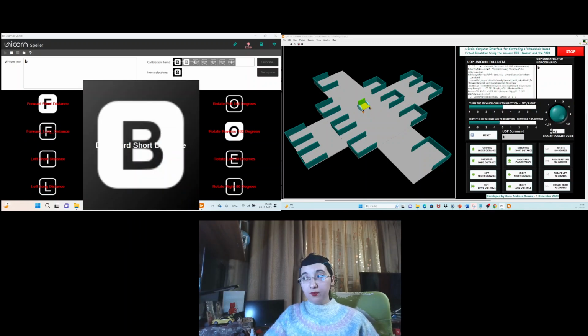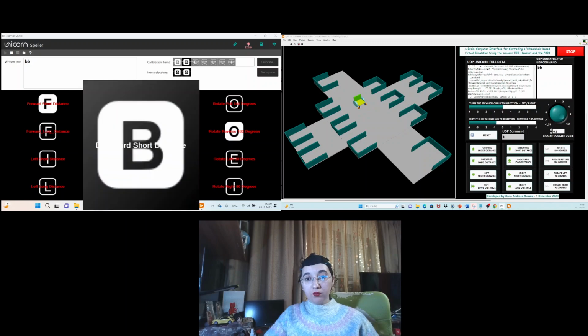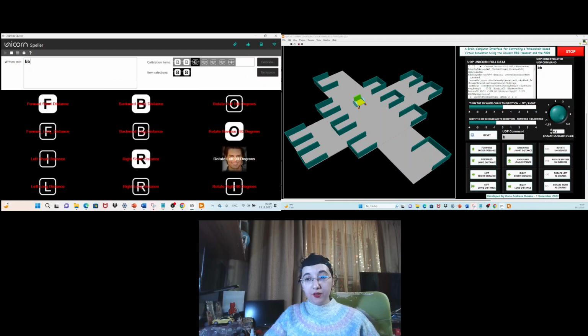Perfect. Everything worked fine. Then rotate left with 90 degrees.